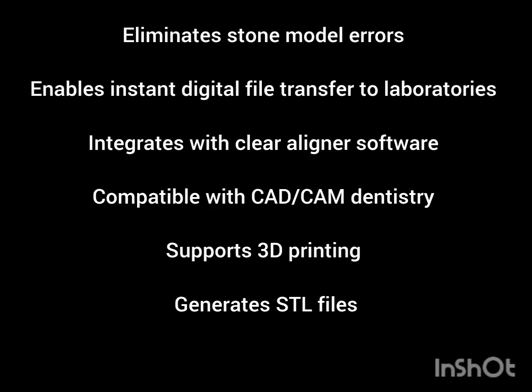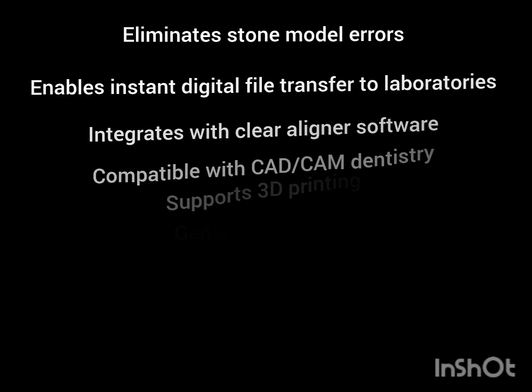And third, a very important advantage, is that the digital impression improves communication with the laboratories because files can be uploaded instantly without shipping physical models. And also, digital records require no storage space, reduce material cost over time, and integrate seamlessly with 3D printing and clear aligner treatment planning.